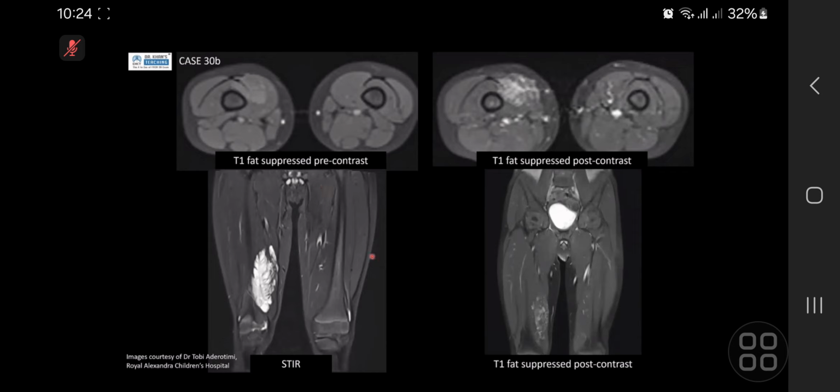Then going on to MR. When you see that, some clinicians, if they wanted to operate on it because it's very extensive, will ask you to do an MR. And MR just shows you, these are the post-contrast and pre-contrast pictures, showing cystic spaces or cystic signal ill-defined lesions, but they just look quite bubbly. And in post-contrast, depending on how delayed you acquire these images, you can get enhancement within them. Okay, this is more on a difficult spectrum, but it's just to complete.